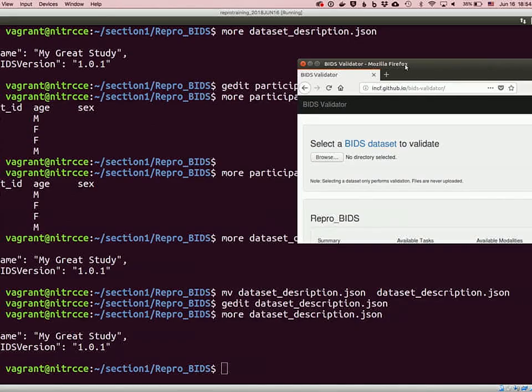Is anyone lost? Yeah, one person. You have two people to take care of. Gedit is a graphical editor, so it brings up a window that way.